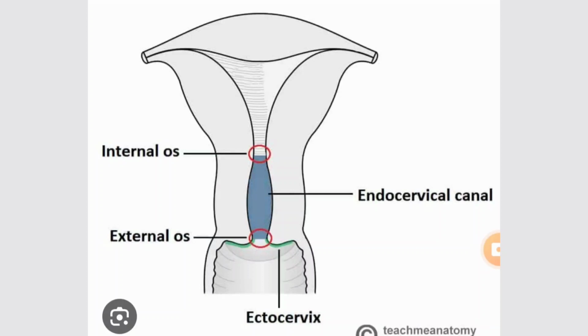So for placenta previa grading, we usually look at the internal os opening. That is the point where we concentrate on the level of the placenta. So let's start looking at the placenta grading. Placenta previa has been given 4 grades. So let's start looking at grades 1, 2, 3 and 4.